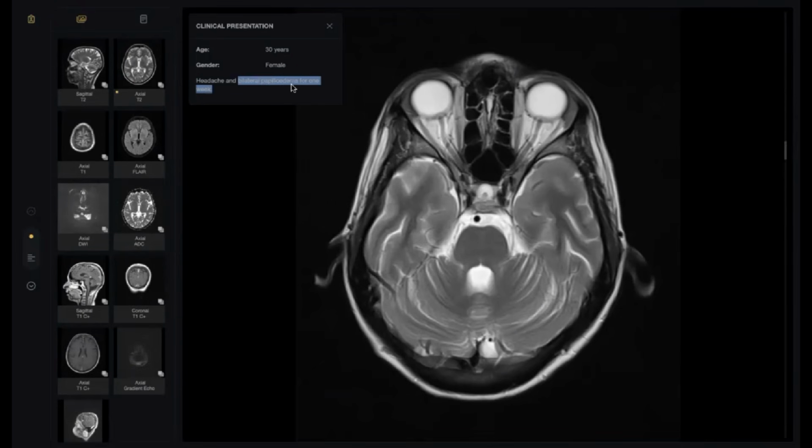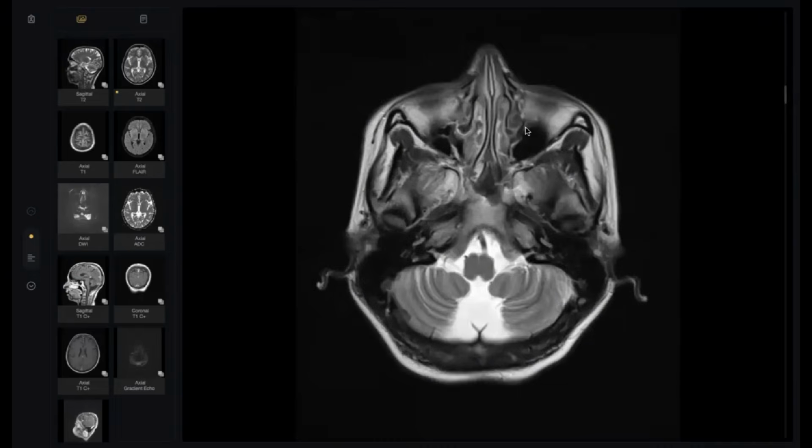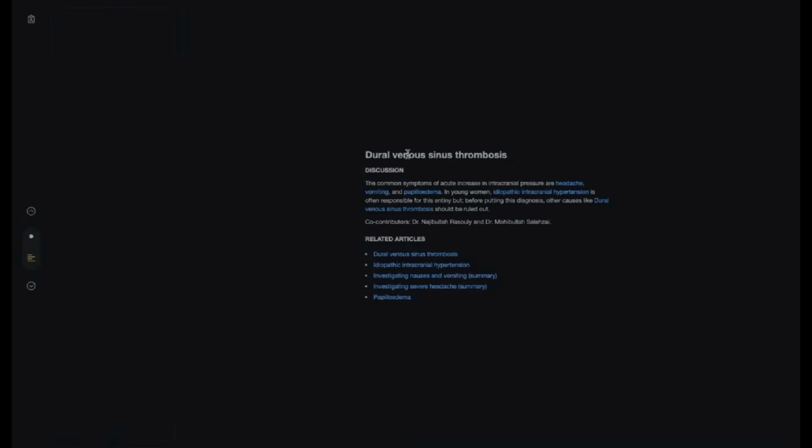The patient has papilledema. Sir, you mentioned this prominence of CSF. I'm thinking of intracranial hypertension developing in this patient, since there is a widening of the perioptic CSF spaces, as well as maybe the sella here looks like partially empty, something like this. Thank you, doctor, so much.